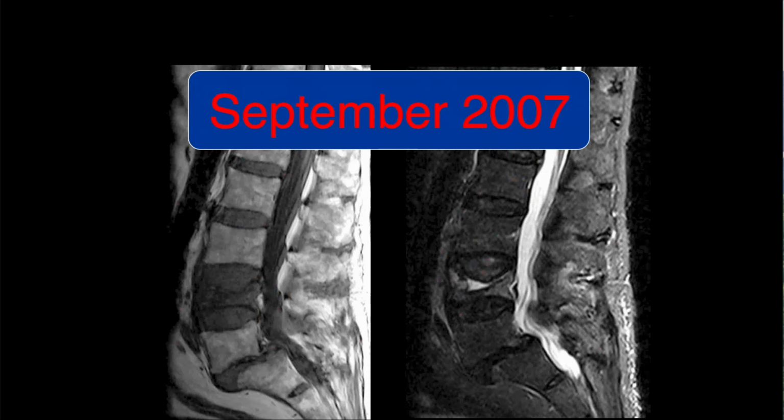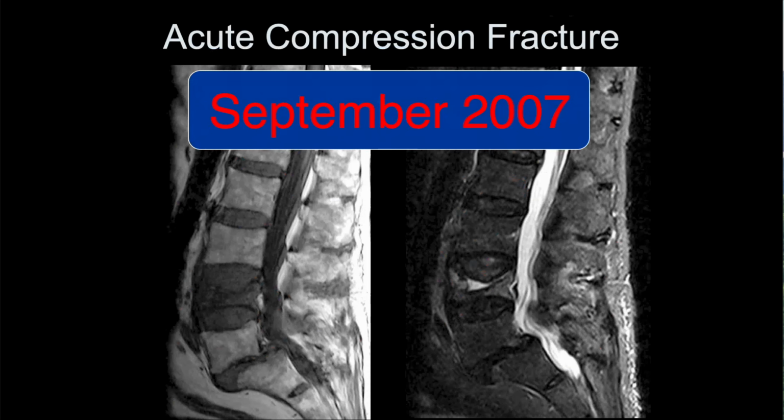So now it looks like there's a compression fracture. There's pretty significant height loss. Progressive disease. And then here we can see that there's actually loss of height, both anterior and posterior, as well as markedly in the center, with some sharply defined hemorrhagic component to this. And this was an acute osteoporotic compression fracture, just to see what it looks like.